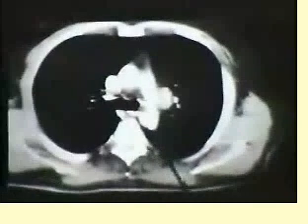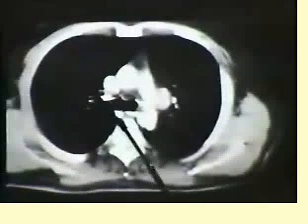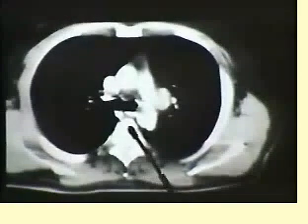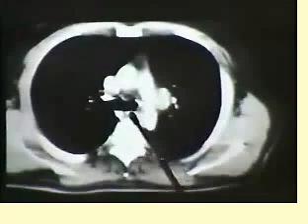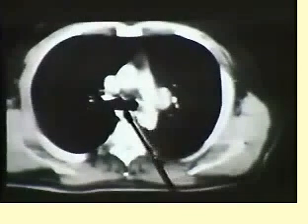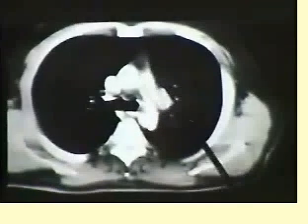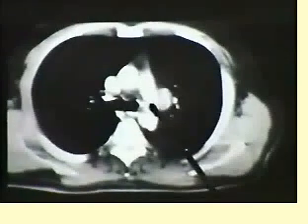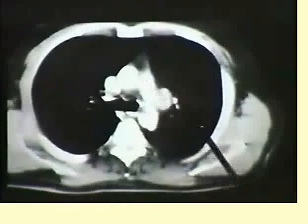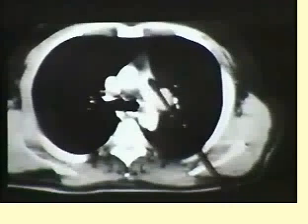If we look at this mediastinum, we have the descending aorta, the ascending aorta. We have a little bit of the azygos vein over here, in fact, as we discussed before. Another rather peculiar density here, but remember, you have to have an esophagus, so we can say that's the esophagus. We have the beginning of the main pulmonary artery here, and we should be going into the left pulmonary artery, but this shadow is much too round and separated from the main pulmonary artery in a very non-anatomic fashion. This must be something extra.